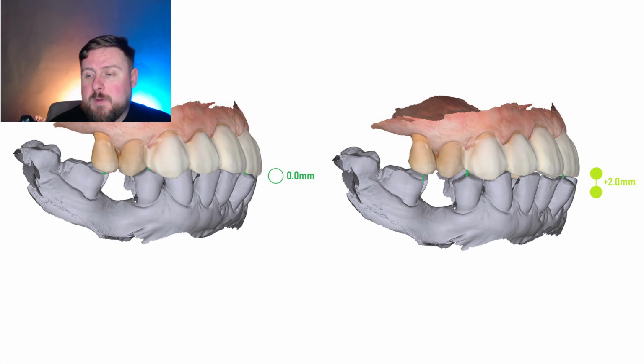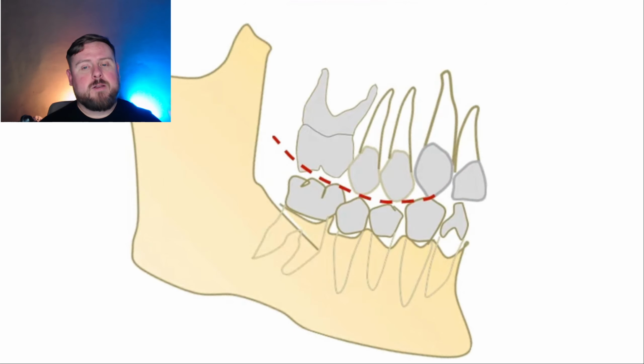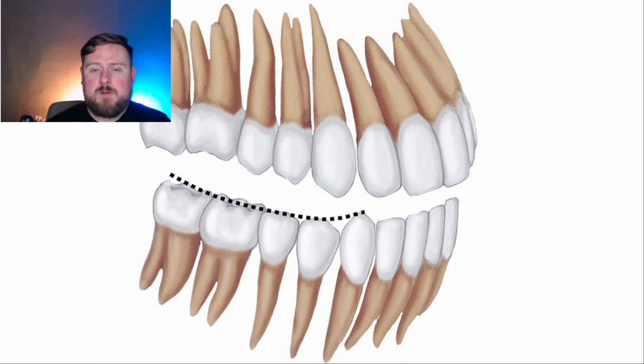As you can see, if you open, for example, 2 millimeters or 1 millimeter, you will have a little bit more space to make the front teeth the needed length, for example. So you can remove a little bit from the buccal side, but also, you can lengthen the total length of the crown if you think you need it. You have to decide. You are professional. And maintain the curve of Spee, Monson sphere, and others.